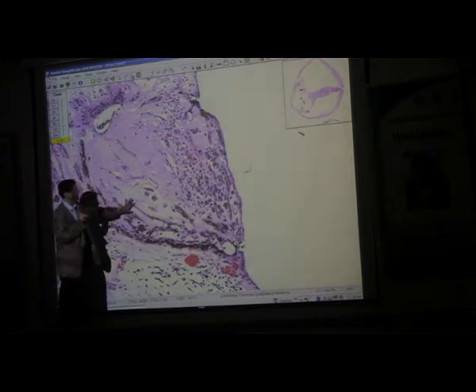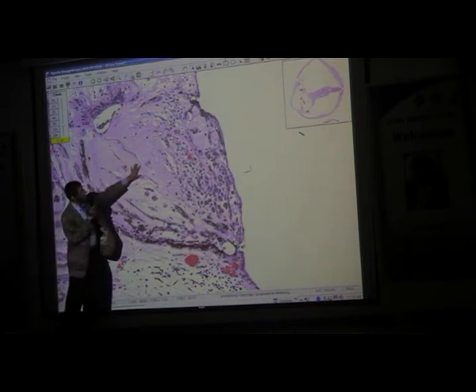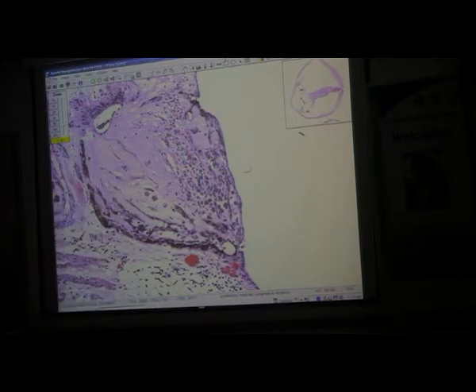Inside the nodule, you have proliferation of retinal pigment epithelium. Now, before we were talking about the difference between retinal pigment epithelial hypertrophy, the enlargement of an individual cell, and hyperplasia, an excess proliferation of cells. I would classify this as retinal pigment epithelial hyperplasia. And also you have fibrous metaplasia of the same thing, forms a little bit of a nodule. Because of the presence of the pigment epithelium in there, what color do you think this elevated ridge would have looked like? It's pigmented. We're looking at the pathology of a demarcation line.